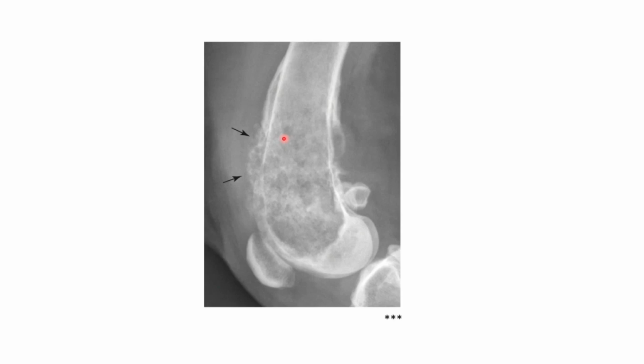It's at a predilection site for osteosarcoma. There's evidence of permeative lysis, cortical destruction, an irregular periosteal reaction, and there's an indistinct long zone of transition. So this is absolutely an aggressive lesion, and top differential would be osteosarcoma.